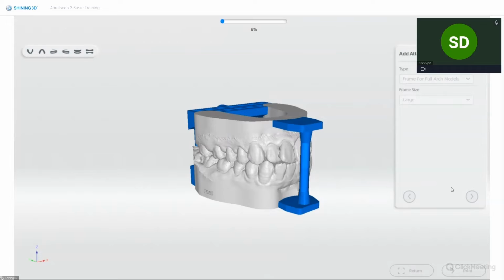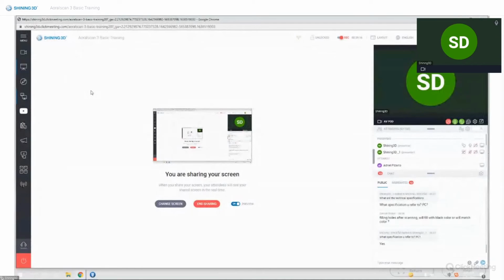It will take some time to do the processing also. So let me check if you have any questions.